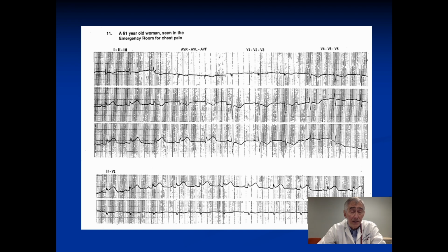We're going to look at whether it's sinus rhythm, upright P in 1 and 2, negative in AVR. So that tells us that it's sinus rhythm. Then we look at the axis. It's positive in 1, it's positive in 2, normal axis. Then we look at the intervals. PR is normal, QRS is normal, the QT is less than half the RR interval at a normal rate. And then we look at the morphology. The QT is normal. But this time we see ST depression in 1 and AVL.